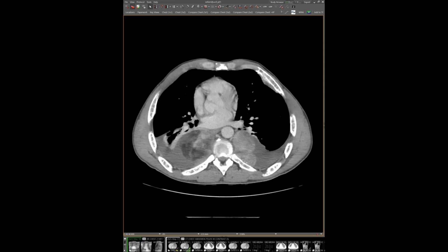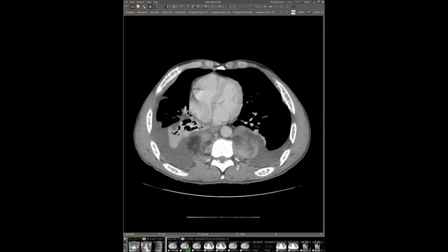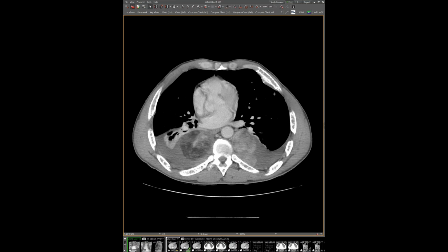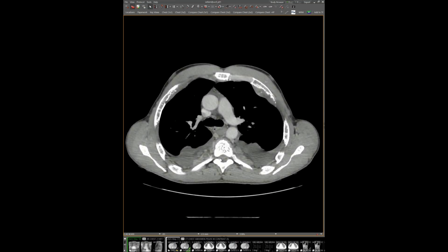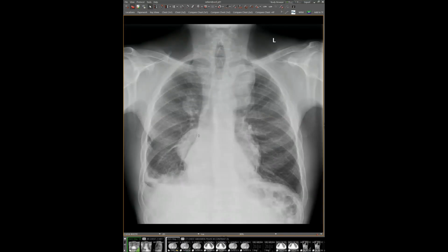Absolutely. You even see it inside the ribs anteriorly. Crazy. Yeah. Can you go back to the radiograph? I thought the ribs looked a little funny. Yeah, I agree. If you look at the clavicles too, they look just way too lucent for somebody as young as this. And the ribs too, especially down here, you can see where you've lost any normal central opacity. That's beautiful.